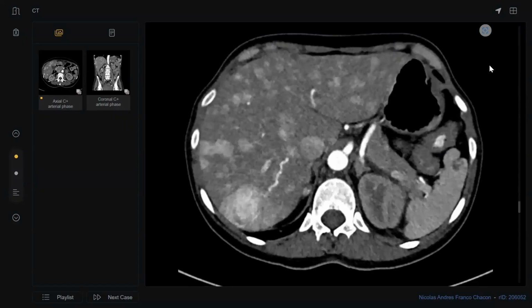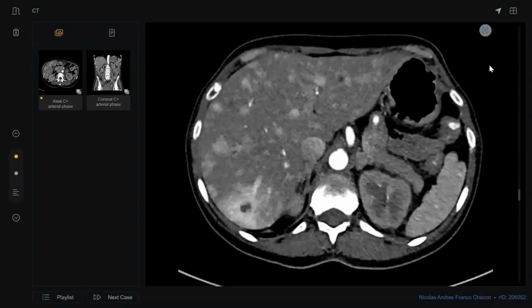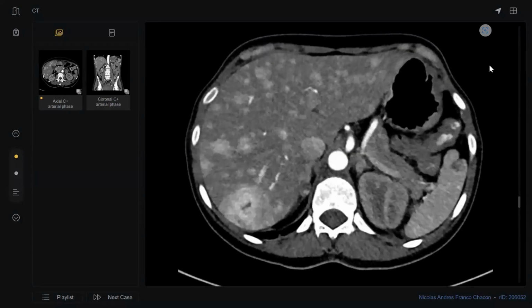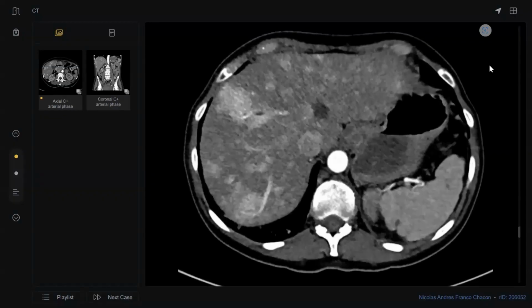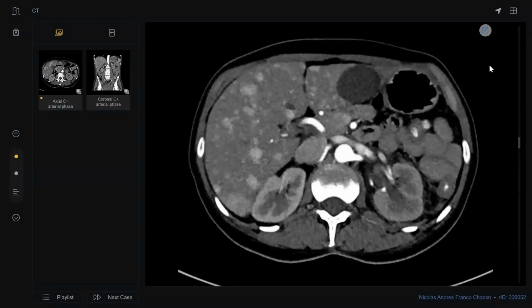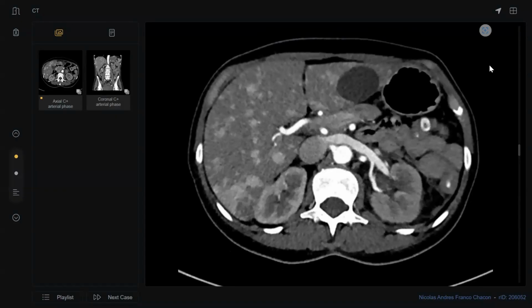Okay, what else? Without a definitive lesion, I look again at the left kidney. Because it is diffusely attenuating, I'm just trying to look at the left renal artery, if there is any possibility of infarction. What happened here?